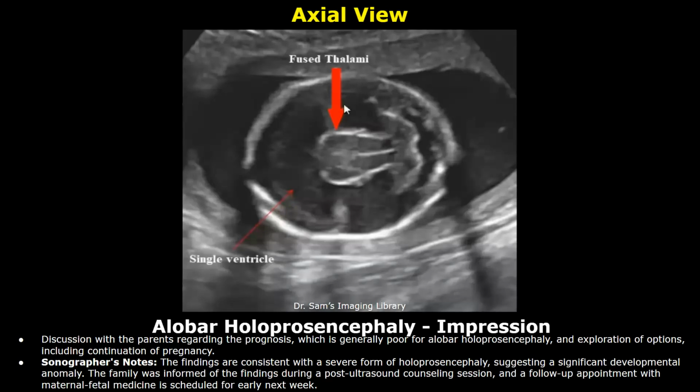of pregnancy. Sonographer's notes: the findings are consistent with a severe form of holoprosencephaly, suggesting a significant developmental anomaly. The family was informed of the findings during a post-ultrasound counseling session, and a follow-up appointment with maternal fetal medicine is scheduled for early next week.